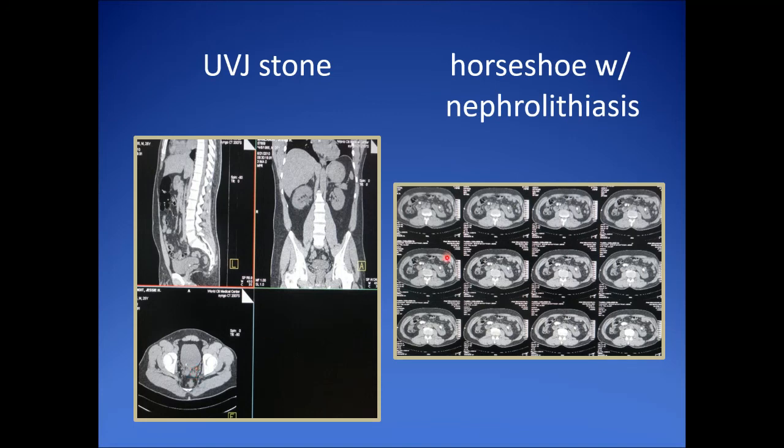And sometimes we could see congenital anomalies such as this one. The axis of the kidney is now not normal, such that the inferior pole of both kidneys are joined together by the isthmus just anterior to the vertebral body with hyperdense structures representing nephrolithiasis.